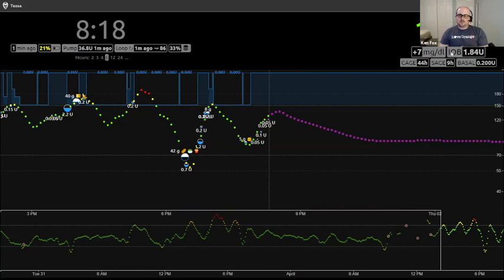The easy ones are over here. You might hover over the cage or sage icons, which we'll talk about in a second, but they give you more information than what's readily available here. The one you should all know about because you're loopers is the loop pill. Assuming you have it turned on in Nightscout, you should be able to hover over it and you can see all kinds of information in here.